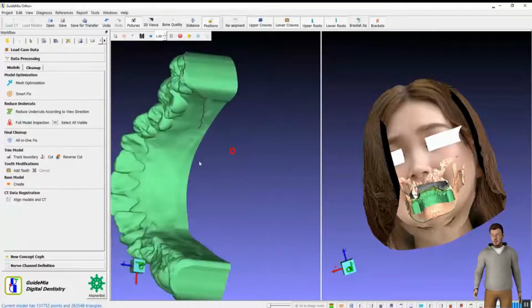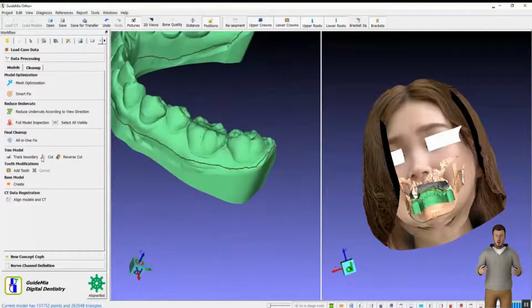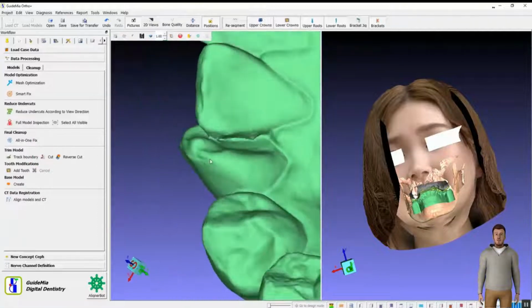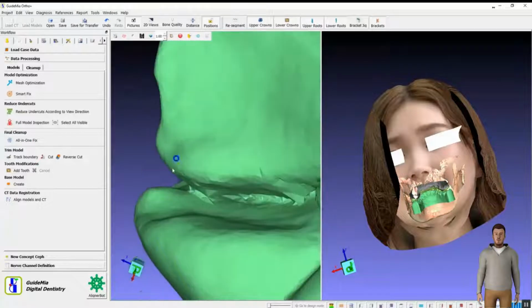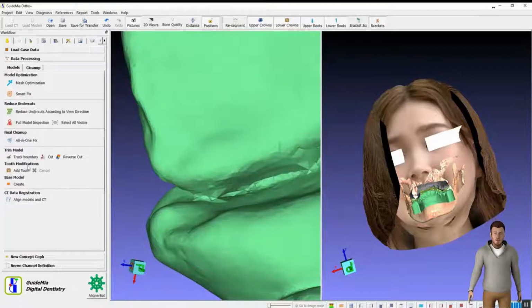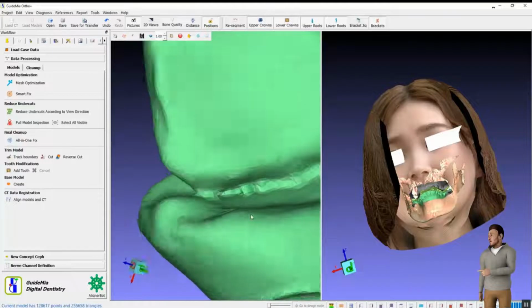One of the reasons we suggest to scan the patient with jaws open is that it can be easier to specify points for registration. If a registration is not well done, you can always use the reset button to start over. Click on the next jaw button, and the case will switch to the lower jaw. The registration process is the same.